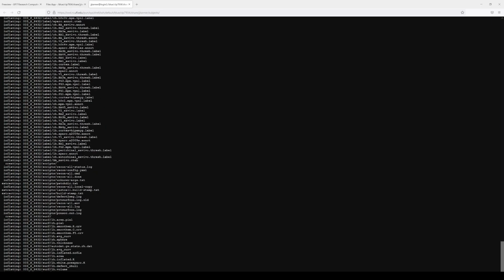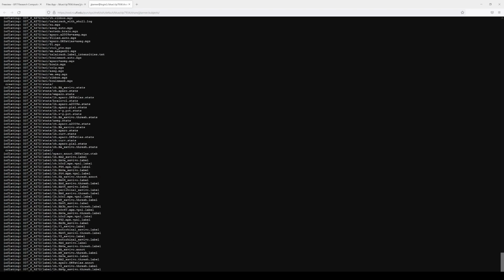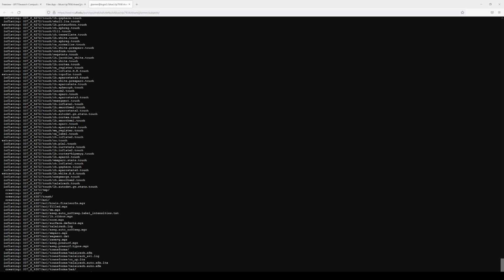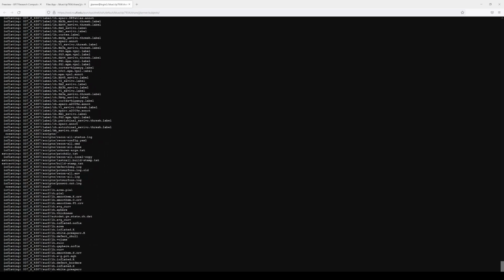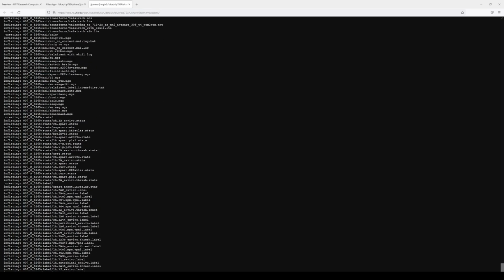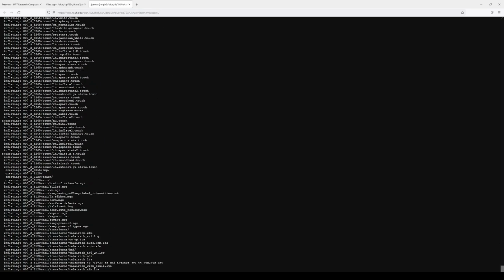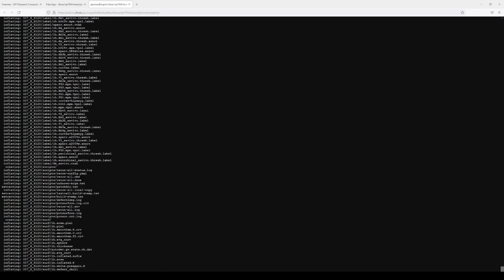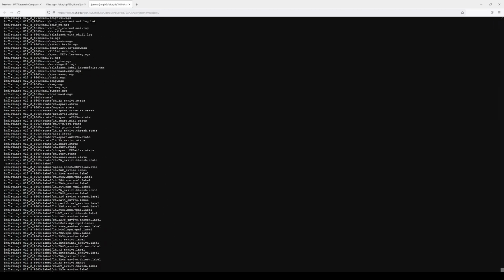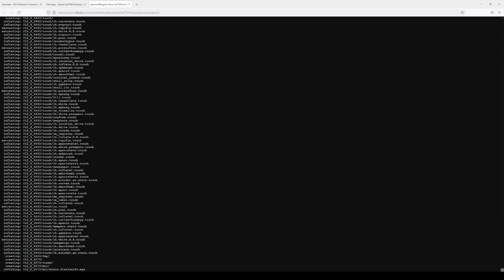Again, what I recommend is if you're going to do any extended processing on HiPerGator, you need to either submit a script, or you can do what's called an interactive development process. And there are ways to do that. I won't show that at this point. But this is fast enough that it won't take very long. And so we'll let that go.